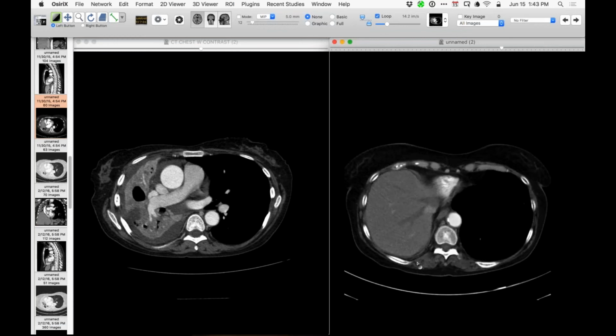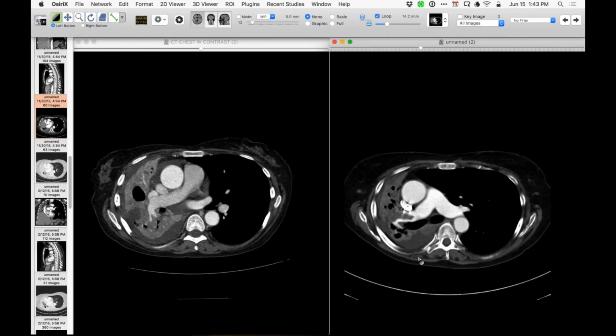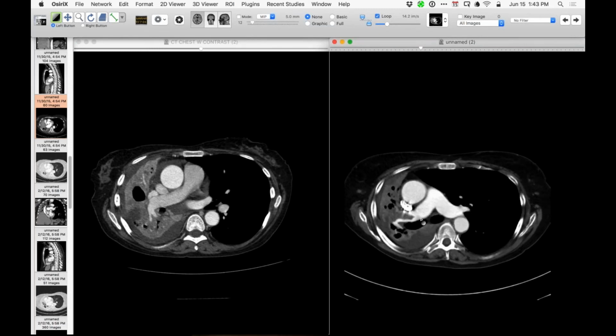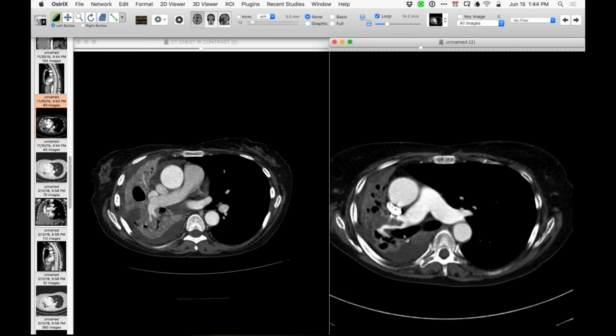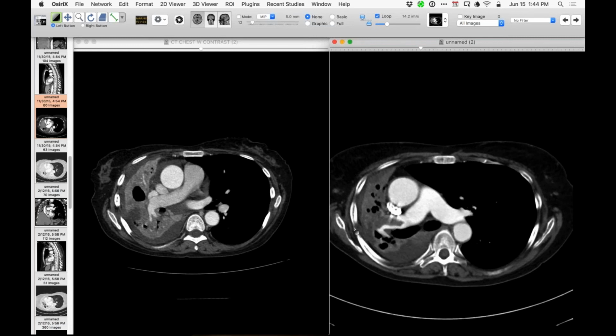Sync, it's really annoying. So you will see here that perhaps analogous to the situation in which one has pulmonary artery stump thrombosis in situ after pneumonectomy. And I think I've shown 1 or 2 cases of a stump thrombosis in the context of a lobectomy. I think it's likely that this is forming because there's really no blood flow going into that lung. Well, there is some blood flow, but it's presumably sluggish. And maybe that's the mechanism by which this in situ thrombosis occurs in the right pulmonary artery. So it's quite large there.